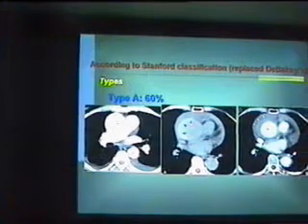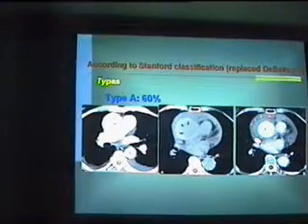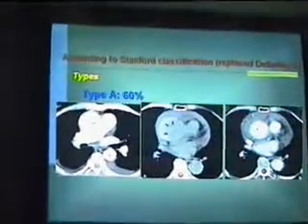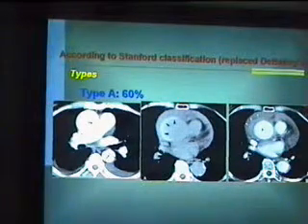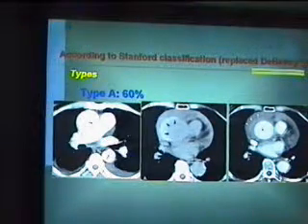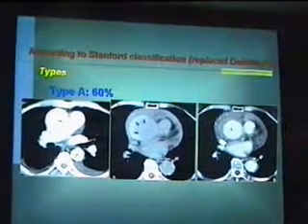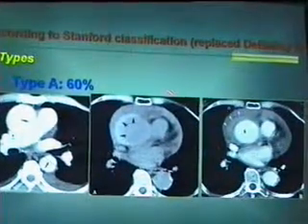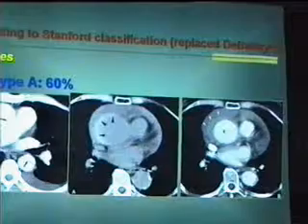وده type A، ودي بعض المشاكل من type A إن عندي هنا حاجة كده ولما أديت كونتراست لقيت الحاجة دي. That's the false lumen and that's the true lumen. الفولس ليومن كتير قوي يبقى هو ثرومبوزد، والصبغة تخش الترو ليومن الأول وبعدين الفولس بعدين. والفولس ليومن عادة بيبقى the anterosuperior portion of the two lumens. This is how I know that this is the false and that's the true. المنظر الشهير ده إن الصبغة تخش لي هنا الأول وتخش في الفولس أو ما تخشش، ممكن ما تخشش.